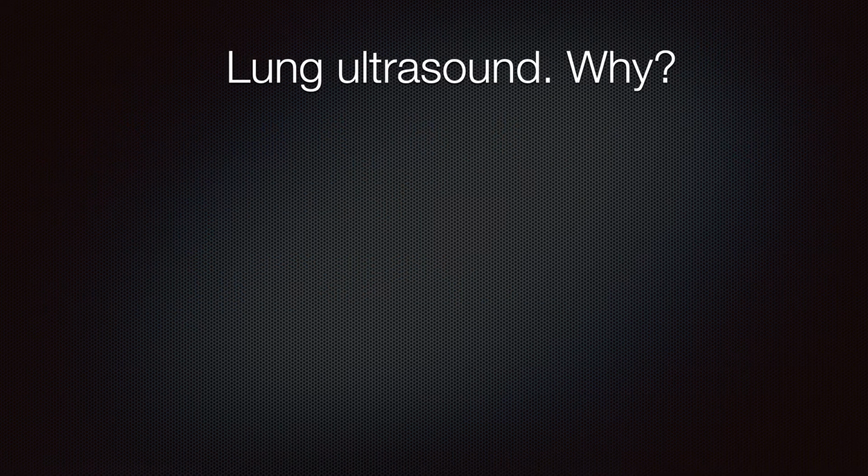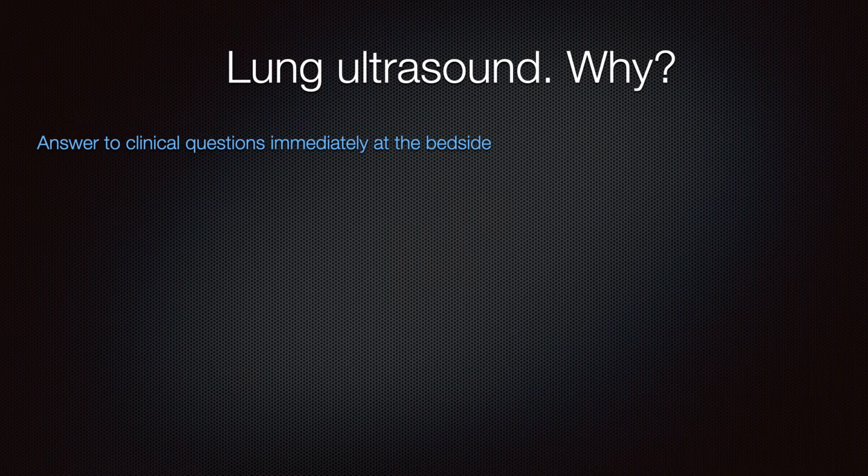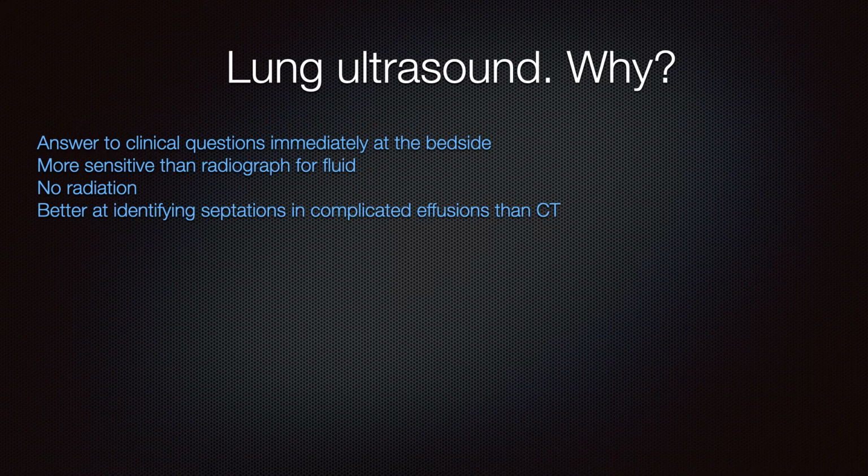So the first question is, why do we ultrasound the lungs? POCUS is unique, and it does ultrasound the lung. There's no referral at this point for lung ultrasound, but it's something that can really answer clinical questions immediately at the bedside, like all POCUS features. The nice thing, though, is it's more sensitive than a radiograph for finding fluid, which is usually what we're looking for. It does not involve any radiation, often no cost to the patient, no risk. It's really better at identifying septations in complicated effusions compared to CT.